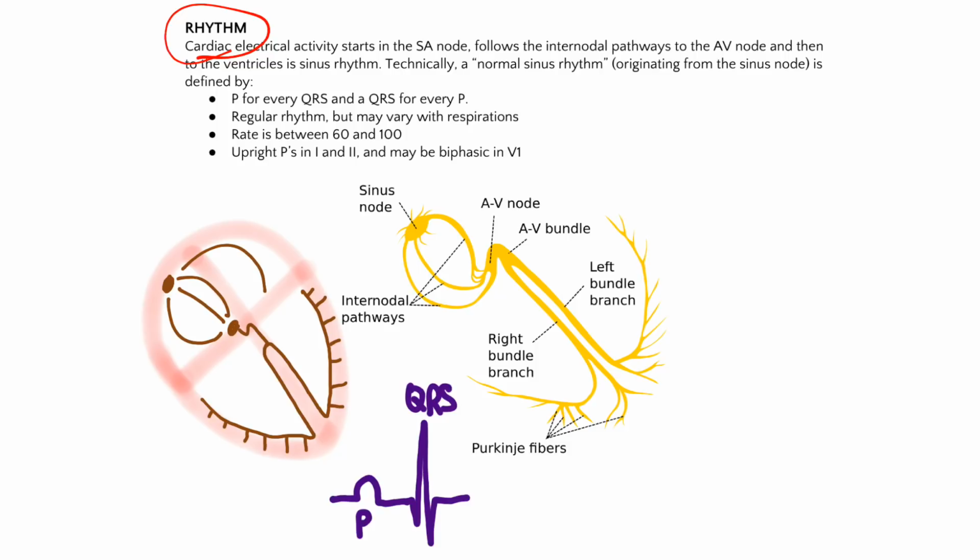And then as the ventricles repolarize, you're going to get what we call the T wave over here. And that's the T wave. And so that's what it will typically look like. And so atria depolarize, the AV nodal pause, the ventricles depolarize, then the ventricles repolarize as the T. And you might ask, where do the atria repolarize? Well, it happens at this QRS time, but it all gets lost in this QRS because the ventricles are so much bigger that waveform basically overwhelms the atria repolarization waveform, so you don't really see it.